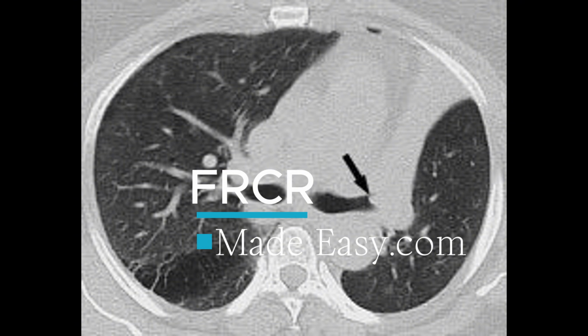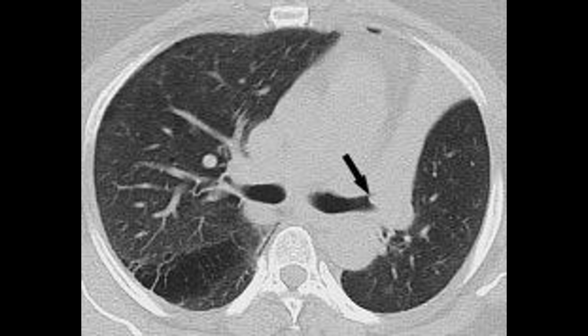In summary, this case demonstrates left upper lobe collapse due to a central squamous cell carcinoma, showing the classic Luftsichel sign, left volume loss, and anterior upper lobe opacity, key high-yield findings that must prompt immediate further evaluation for an endobronchial mass.